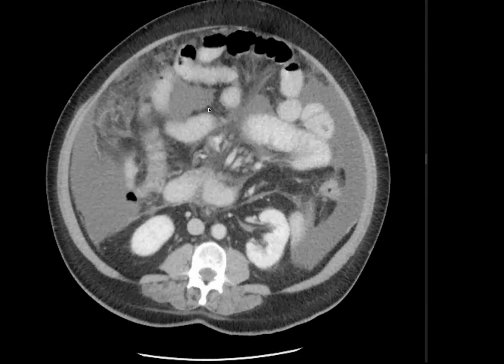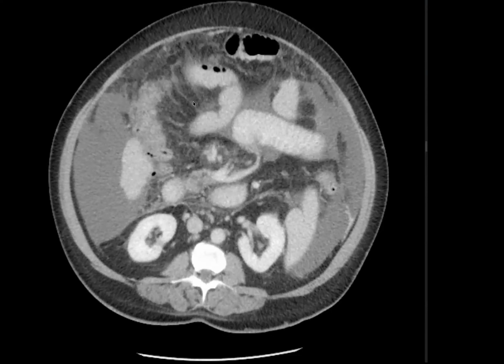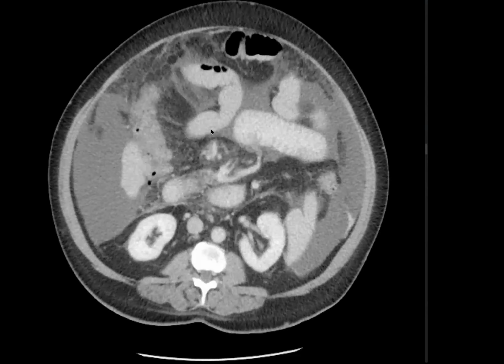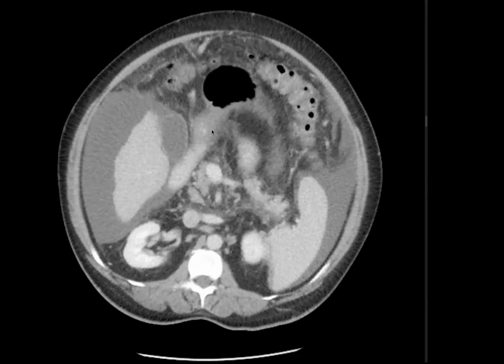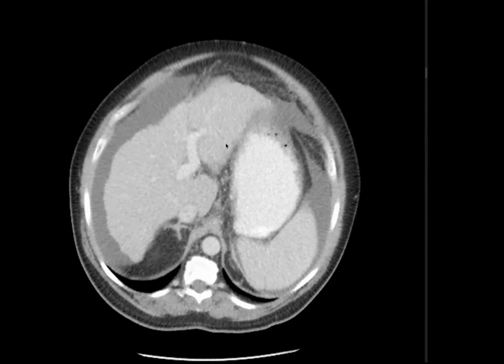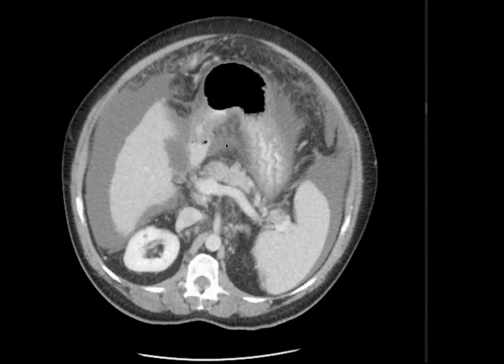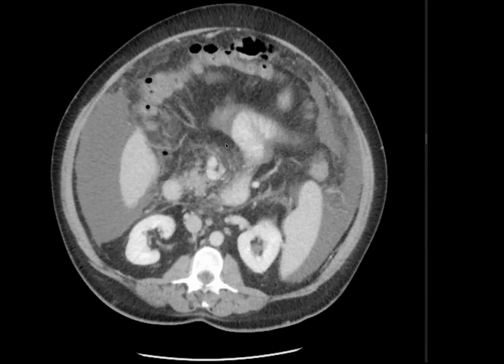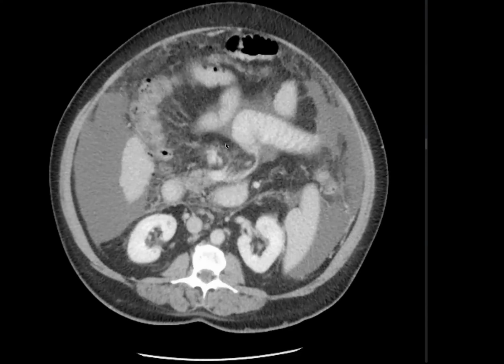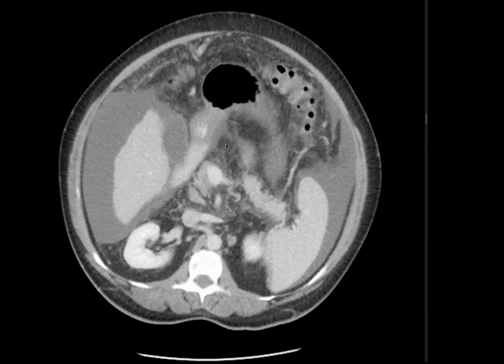Infiltration of the omentum by nodular densities. I think this can also be due to ascites. Can you see any nodular densities that you were referring to? No, not really. So would you then like to change your description for the omental appearance?